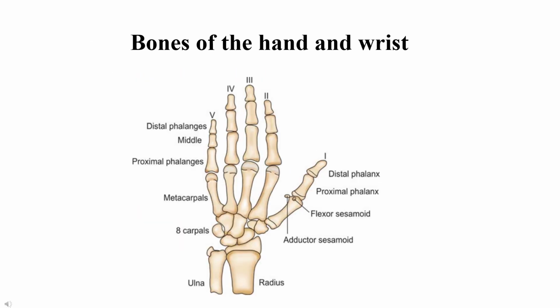To be able to assess the skeletal maturity using a hand-wrist radiograph, we need a basic knowledge of the bones of the hand and wrist, their ossification stages, and the 11 stages of Fishman's index. Let us see them one by one. First, let us see the hand-wrist.